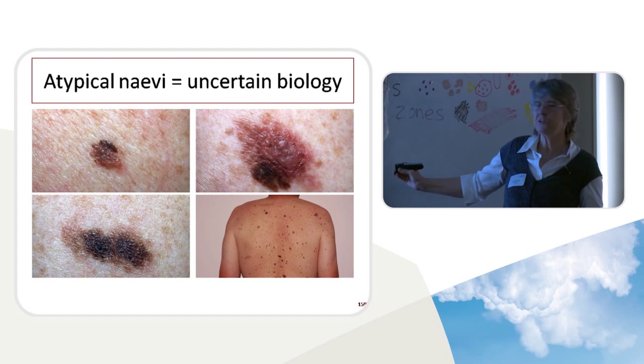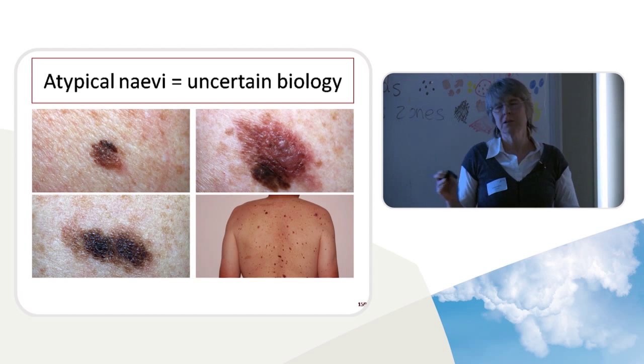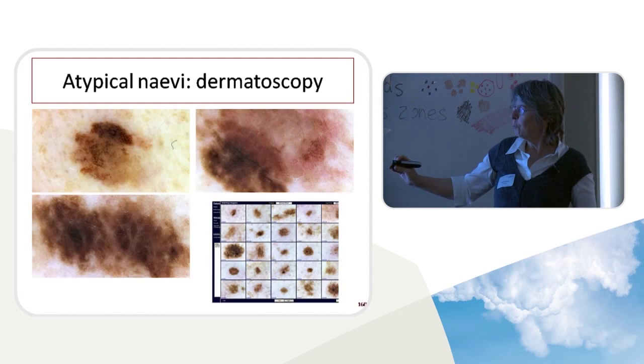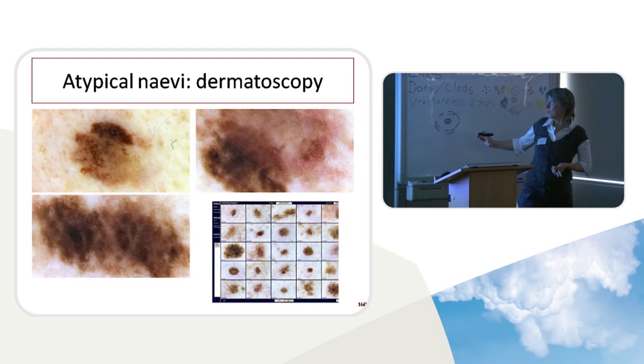And this sort of patient is the don't know one. He died of melanoma, maybe it was that one up there. He'd had multiple melanomas excised, and goodness only knows how many were left on his skin. Dermoscopy didn't help that much, actually, because most of his moles looked horrible. But digital dermoscopic surveillance might have been helpful if he hadn't died, because we would have been able to pick those that were changing.